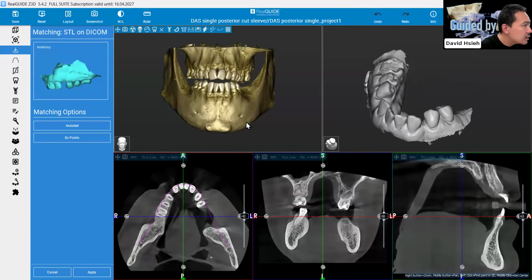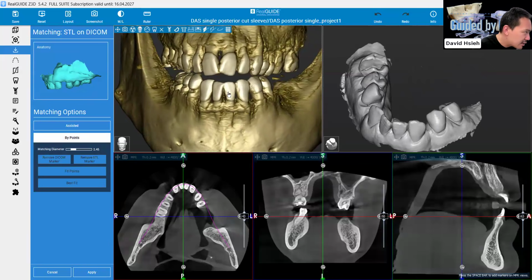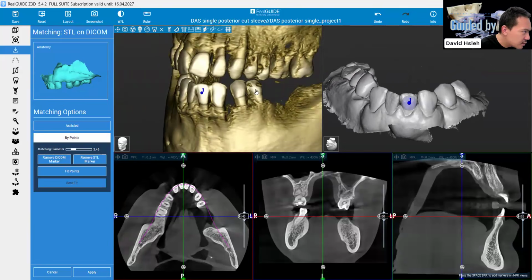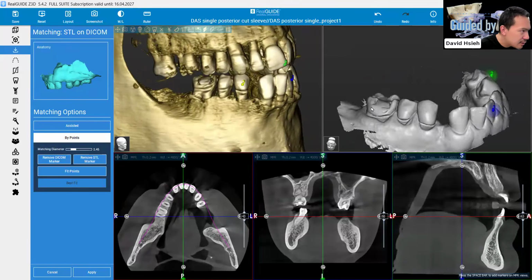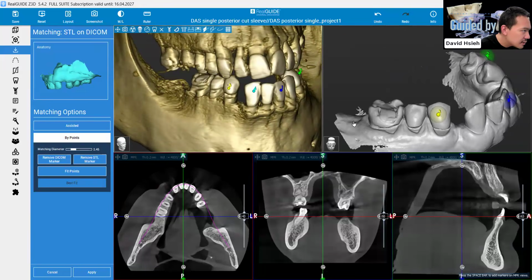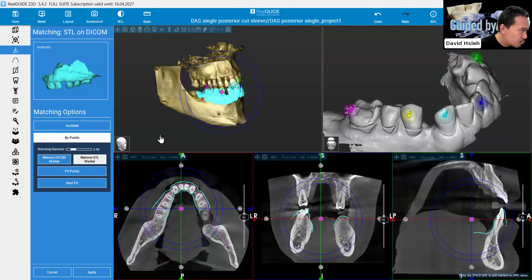In the past, because this 3D model has been segmented, you would select and drop points relative to the model itself. You hit that, and drag that. Let's try that one right here, and then this one right here, and then this one right here. And then we can just hit fit points.